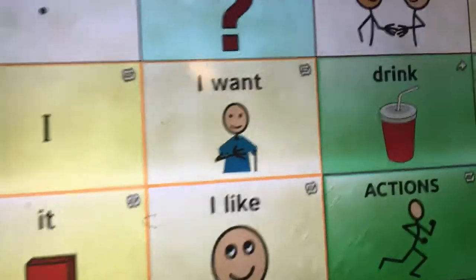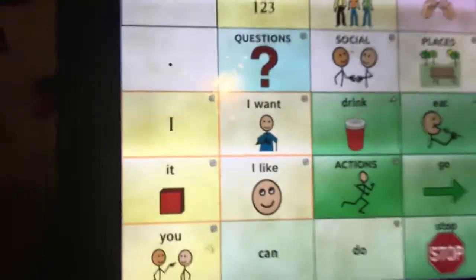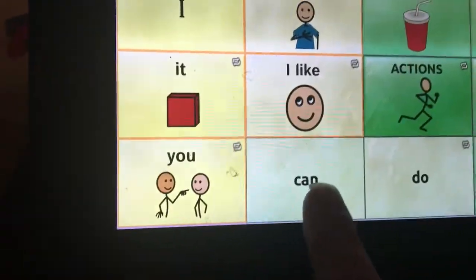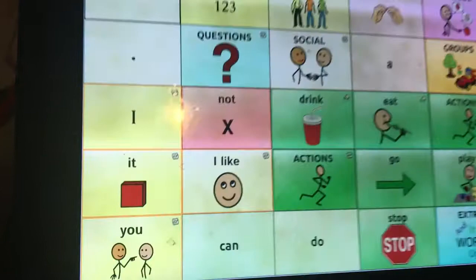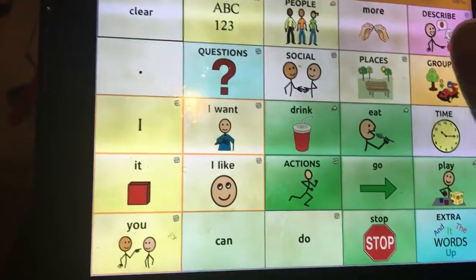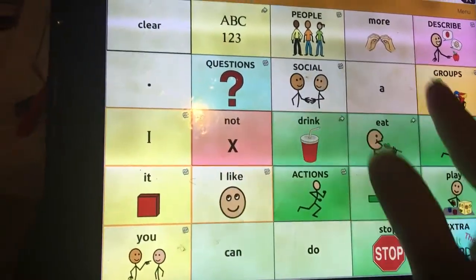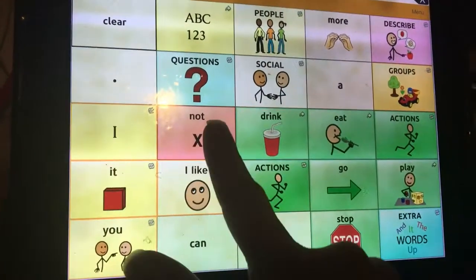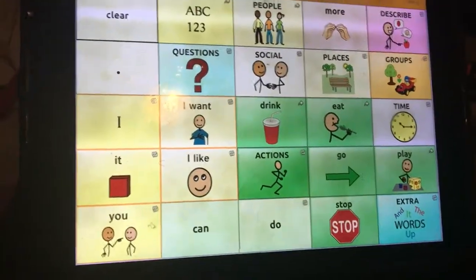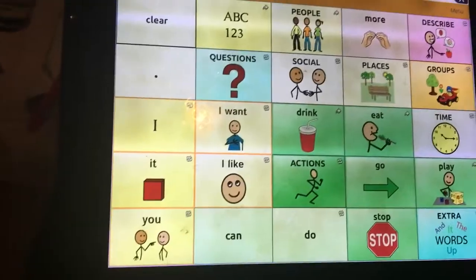If you look, there's those wee little tiny arrows right here. They bring you to another page automatically. So this here where it says can isn't going to bring you anywhere. If you look, it didn't really do anything. It changed a few things, highlighted it. So with can, usually what will happen is the child has a natural response, cannot, so you kind of lose the want, right? So once they say can, then you're wanting, I want out.